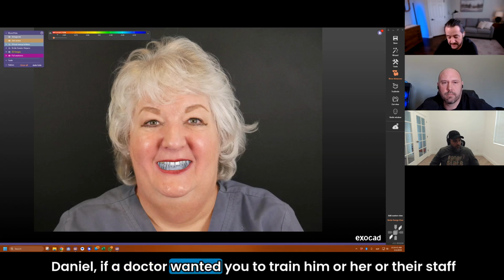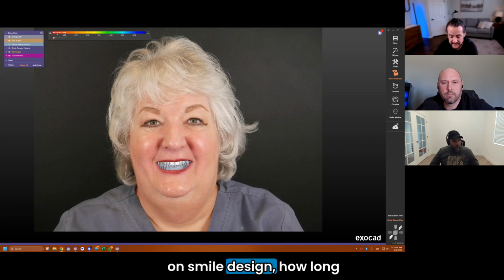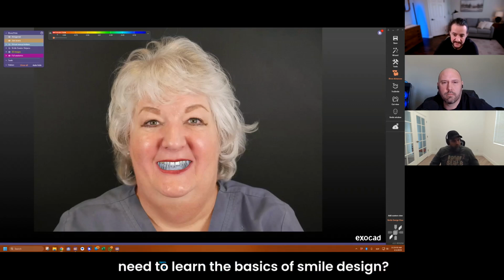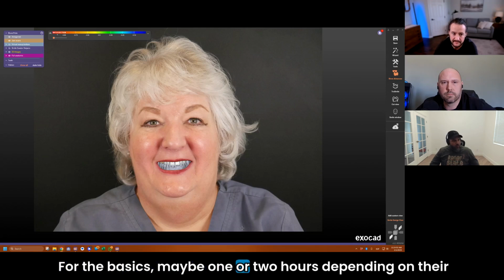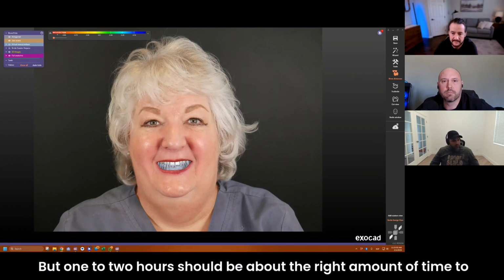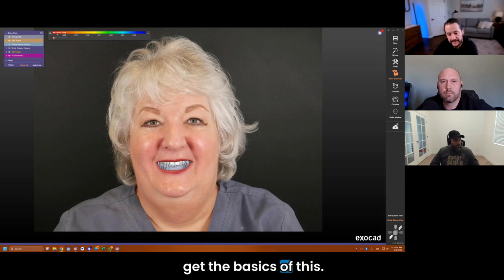Daniel, if a doctor wanted you to train him or her or their staff on smile design, how long would that take you to train them? What kind of engagement would they need to learn the basics of smile design? For the basics, maybe 1 to 2 hours, depending on their understanding of CAD generally. But 1 to 2 hours should be about the right amount of time to get the basics of this.